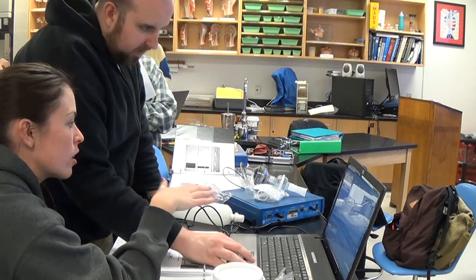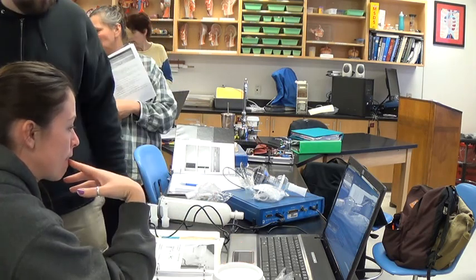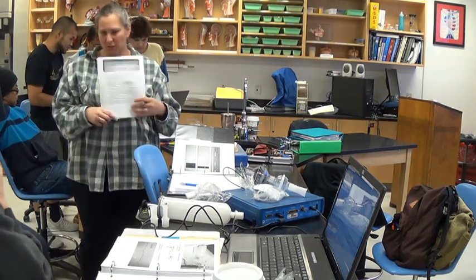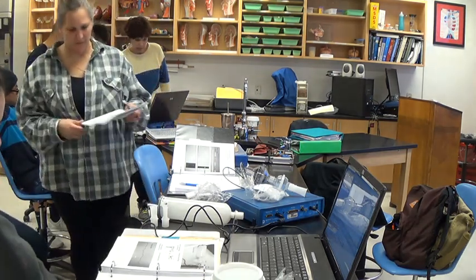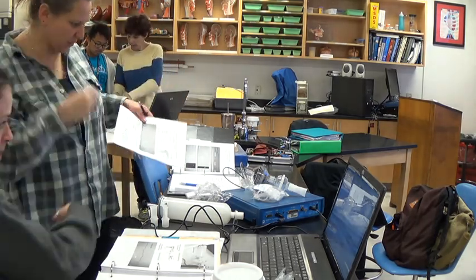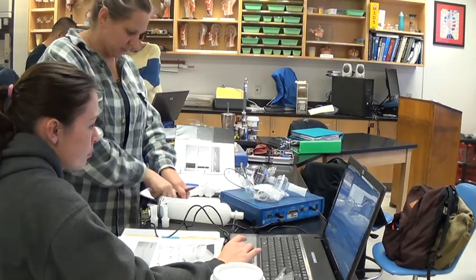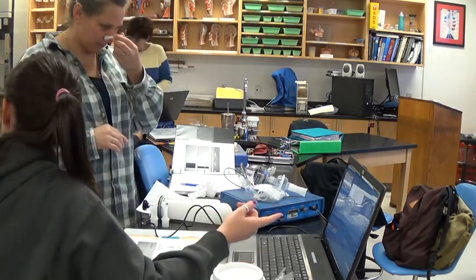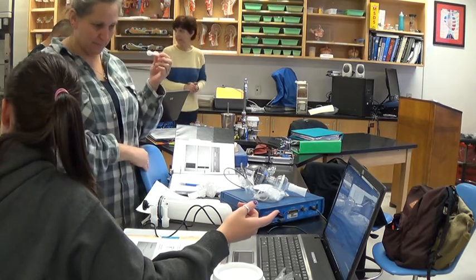So you need to go from the top down, right? Okay, that's what I thought. Keep going. It keeps giving us 4, 5, so we have to do it. What was your title? Your title bar. You're looking at, that's just amazing.